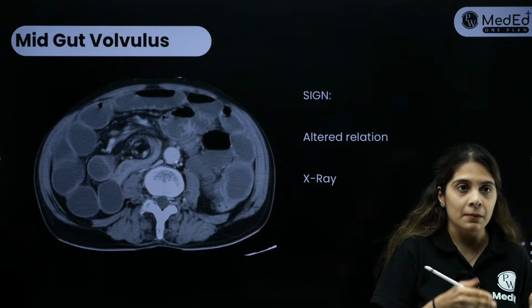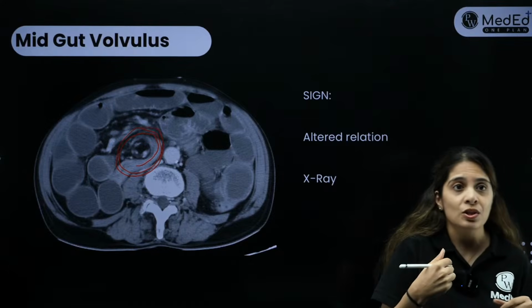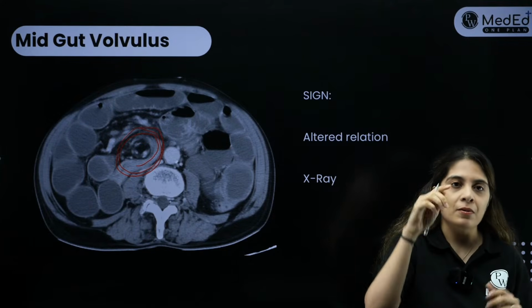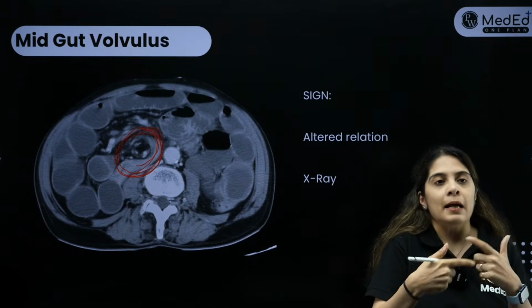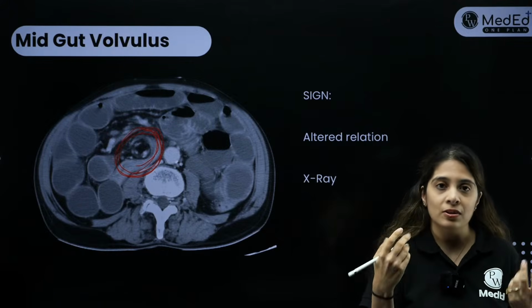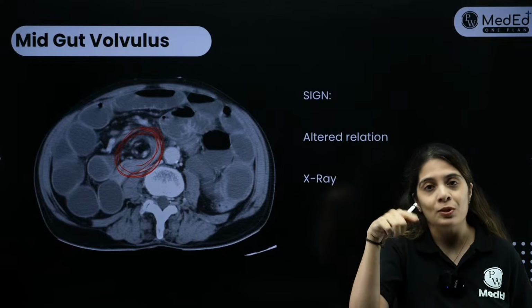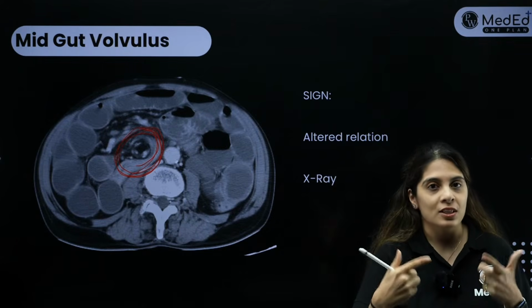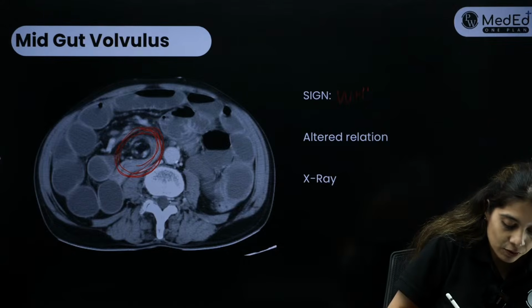So what is this particular image? Again on the CT image, you can see this concentric lamellated appearance over here, right? If you just try to imagine, you are able to see that there is some concentric lamellation. Again, they can show you a CT scrollable stack, or they can show you an ultrasound image in which, in the dynamic movement, you will be able to see this whirlpooling or swirling very nicely. Okay, so this is the sign which you will get. This is the whirlpool appearance.